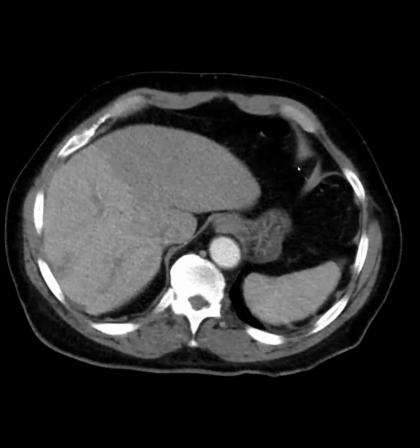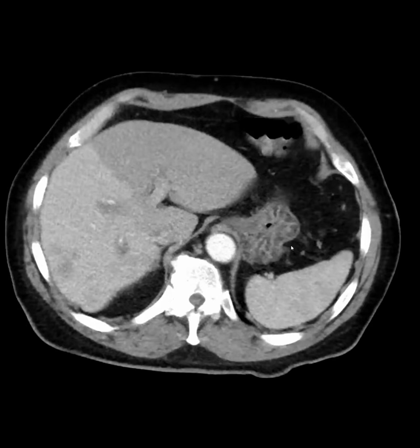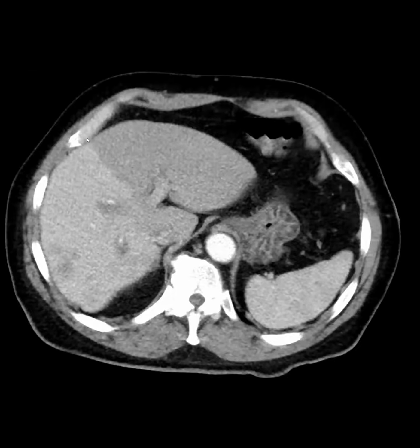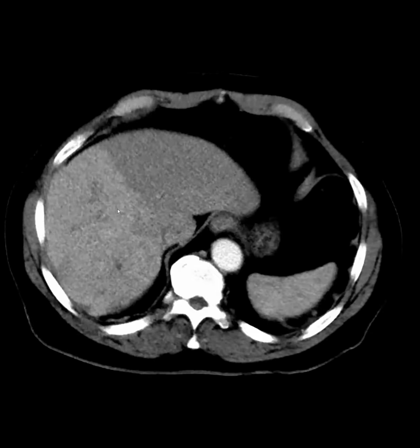Okay, so first of all, the liver has this geographic density, a very sharp dividing line. So which side do you think is abnormal? The right side, because it looks heterogeneous. But say it wasn't heterogeneous, say it was just bright. In general in the liver, when one side is bright and one is dark, which side do you think is more abnormal?